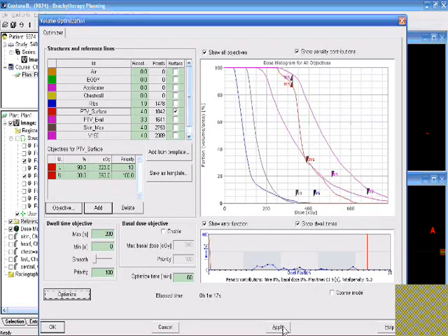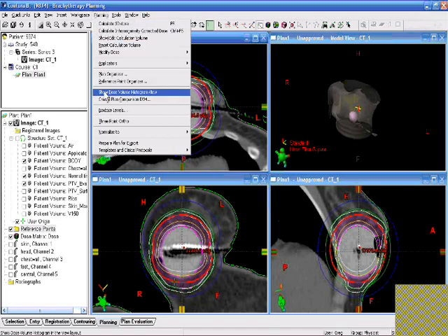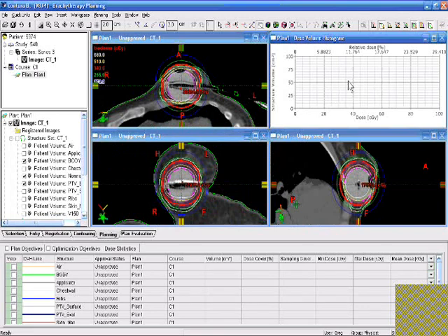Right there yet, I imagine. Now, we will do this just the same way we did before. We will turn on the dose volume histogram view. First time we do that, it'll automatically do the 3D dose calculation, I believe. So we have to select which structures we want to see.